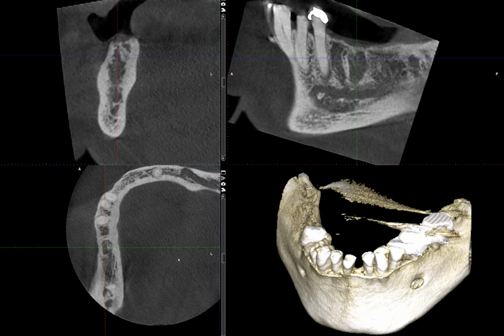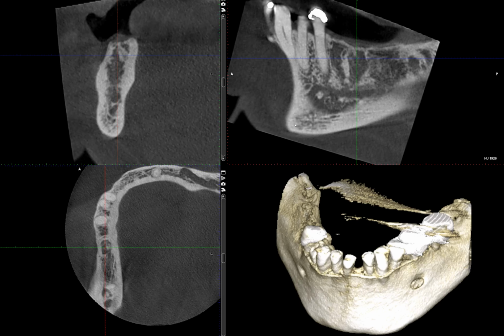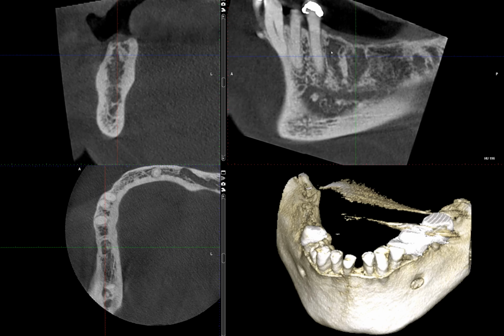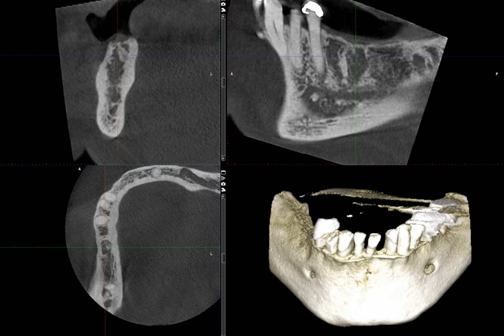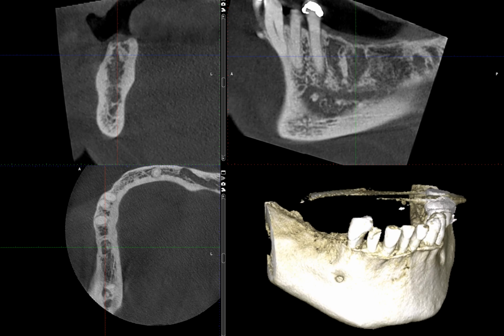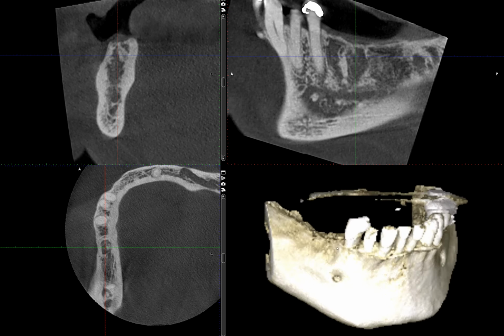I have already oriented my cone beam CT scan so that you're able to see the corrected sagittal view of the area. One thing that I want to tell you is that here's the area of interest, site number 30, but just the way I have oriented, it looks as if you're looking at the site of number 19. I just want to confirm one more time from this view that indeed you're looking at the patient's right dentition. So here's the site of number 30.